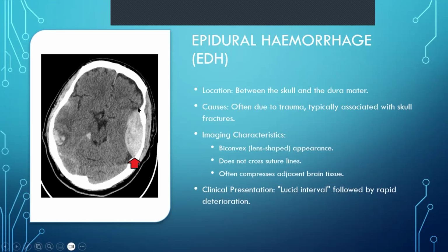So like I say, you've got this tough dura mater that's normally attached to the skull, and then you have blood that starts accumulating from a focal point, and then it slowly starts pushing the dura mater away from the skull, and that's what creates this. So generally, the apex of this, in other words, the furthest point, is normally where the bleed originated. So most of the blood started collecting from here, and then it slowly but surely started making its way out. Now, it's not always the case. I'm just saying that's generally how it often occurs.